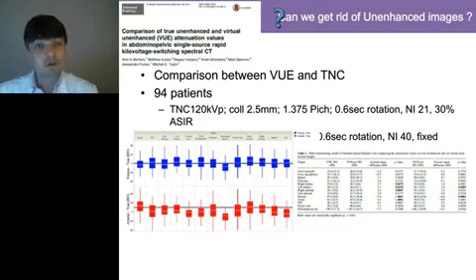That's the first message. The second message is, well, we have to work on that to improve the virtual non-enhanced reconstructions. Remember, because they are reconstructions, if we can improve the algorithm providing that virtual non-enhanced view, we will improve the way those images look. And remember the image I showed of the occlusion, they were actually distinct, something different from what you could see in clinical practice.